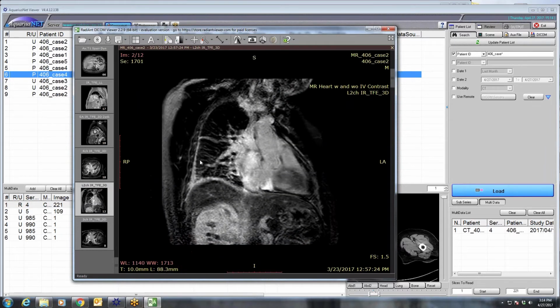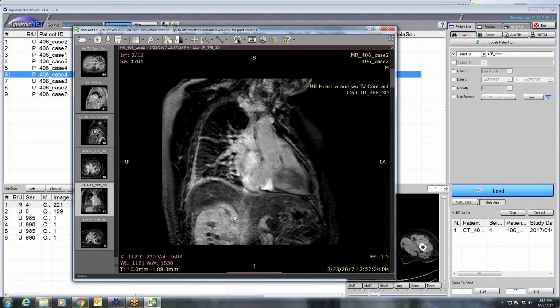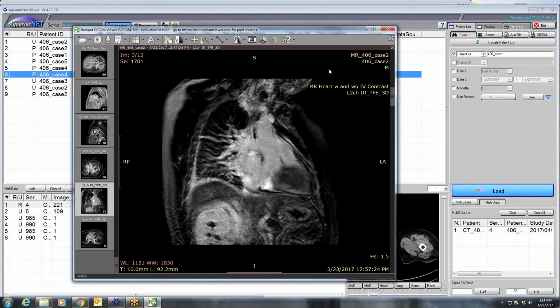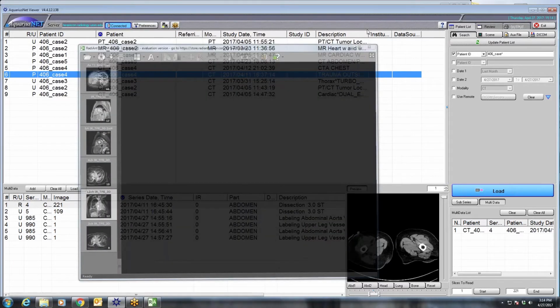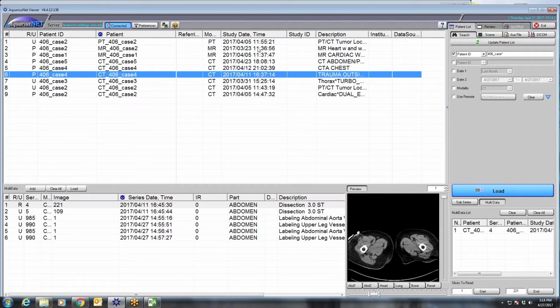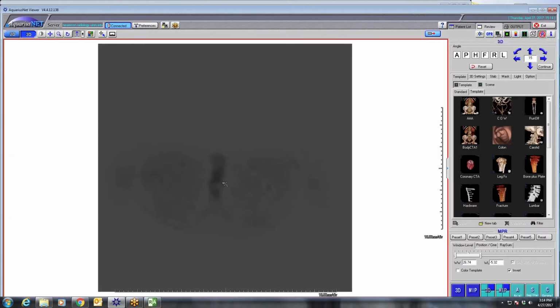And then sure enough, we get some view of the perirenal soft tissues on this delayed. And I'm like, maybe it's Erdheim-Chester. And got a MR, or sorry, PET. And it looks like only part of it came up. I don't know where the rest of it is, but crap.